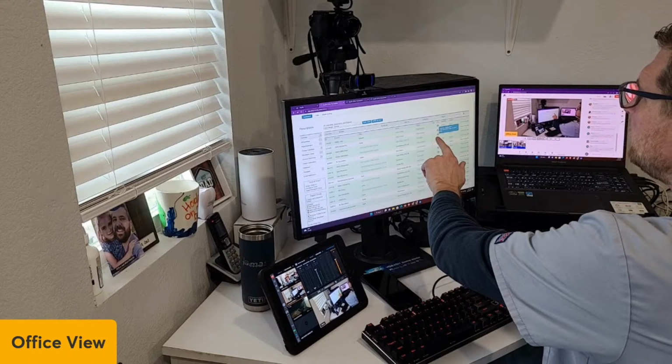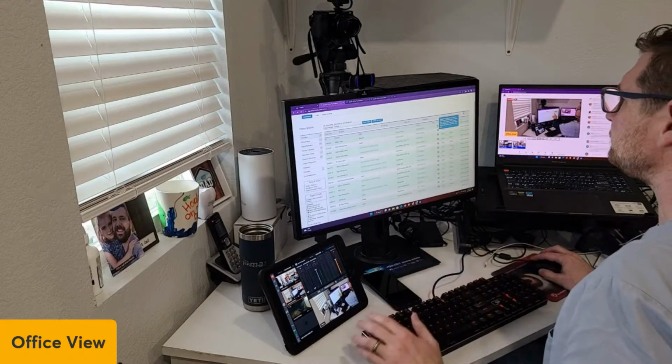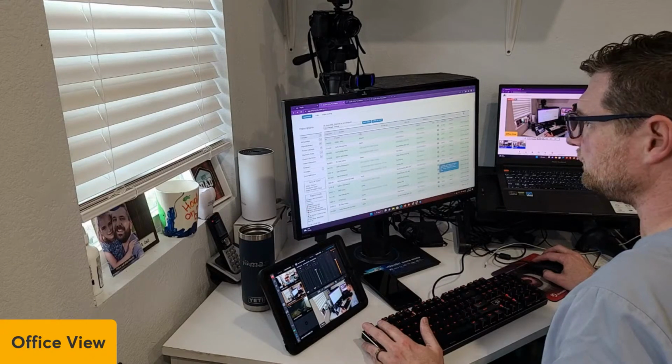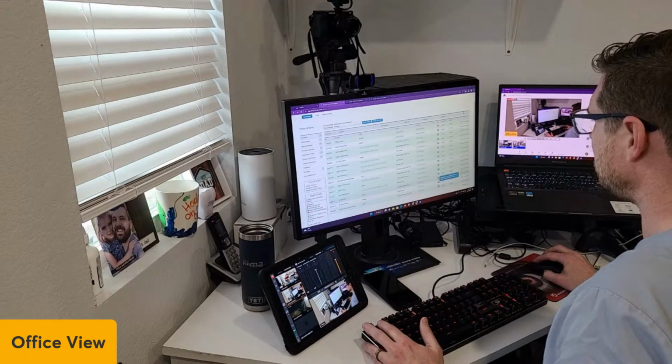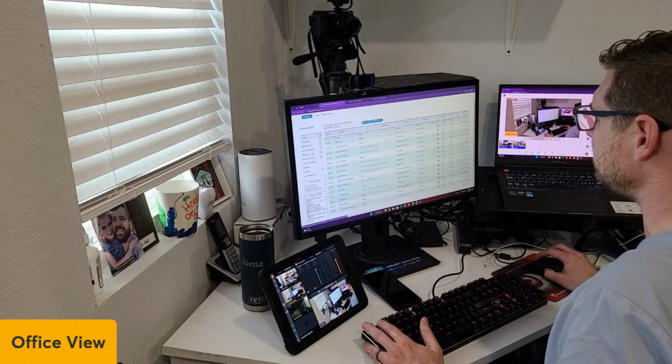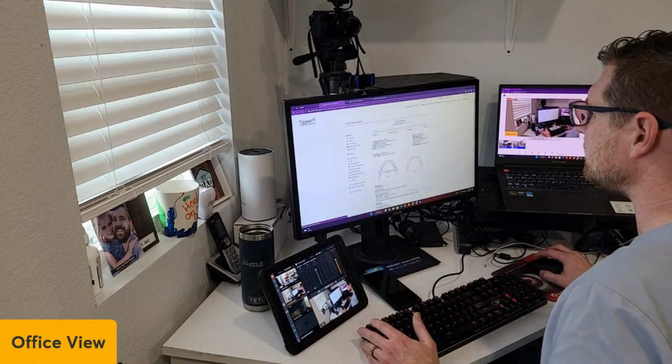RPE bonded. Well, you know what? Let me just. Oh, no. Try that one. There we go. All right. So I'm going to go into this case. I'm going to view it. Haven't checked it in yet, but I'm going to go ahead and prep these bands.